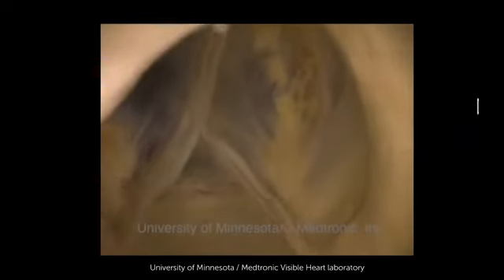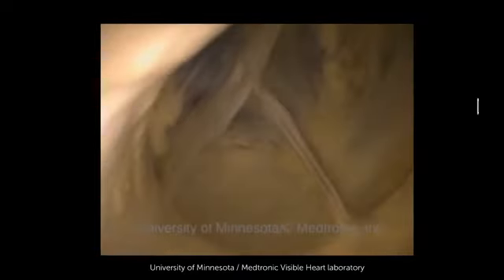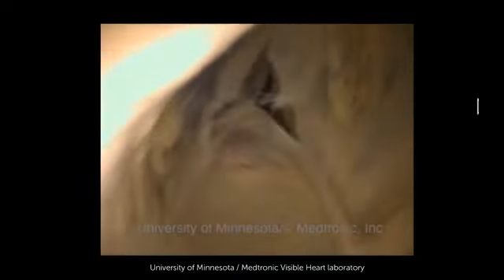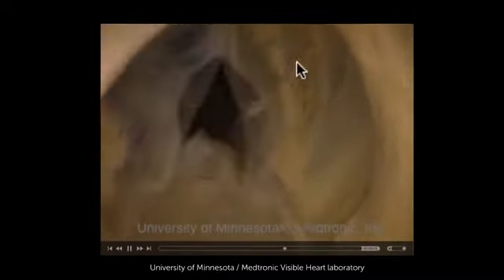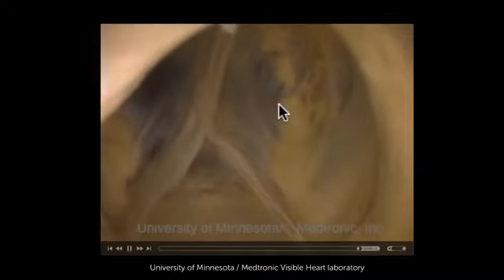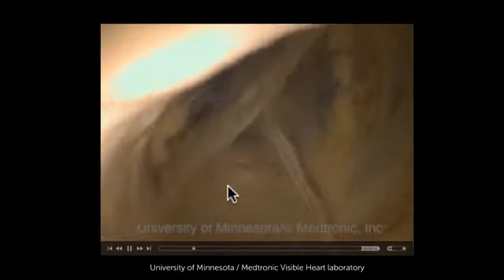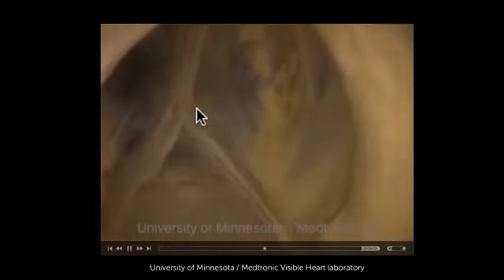But before we turn to diseases of the valve, we first need to recognize the typical features of a normal valve. First, the aortic valve. What you see here is a special heart model which allows us to look right into the heart and also at the heart valves. What you can see here is the aortic valve, which is not completely normal because if you look closely, there are sclerotic plaques actually on the cusps. We have the acoronary cusp here, the right coronary cusp, and the left coronary cusp.